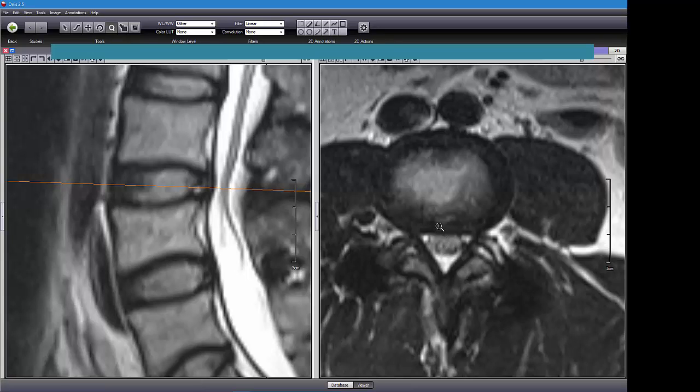To recap, what is causing his horrible leg pain? I need that flexion extension MRI or flexion extension X-ray study done to see if he's unstable. I suspect that he's unstable somewhere. That's the only explanation I could have. Now, for the right leg, I can totally explain it. The pedicle screw is right into the L3 nerve root. The L4 nerve root looks like it could be getting irritated as well by the pedicle screw being too far.